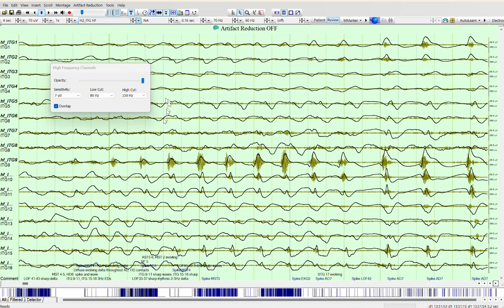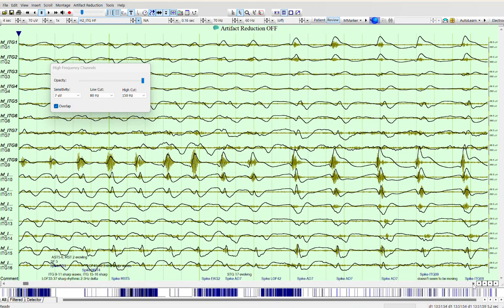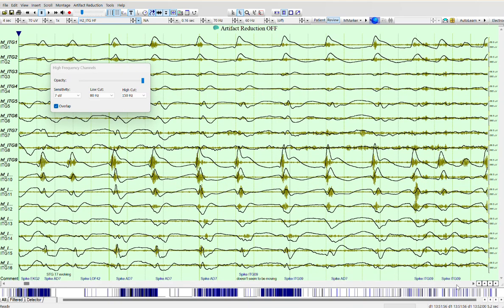So now we can see that here's my ITG9 and my ITG15 channels, and I can go a little bit further. These arrows really jump between events and pages, so if I go over the scroll bar, this may be a Windows 11 thing where you have something fade in and out like that. It is living in Windows 11 at the moment. You can run this on Windows 10 as well. Hence the rounded corners on the program. That's a Windows 11 thing.